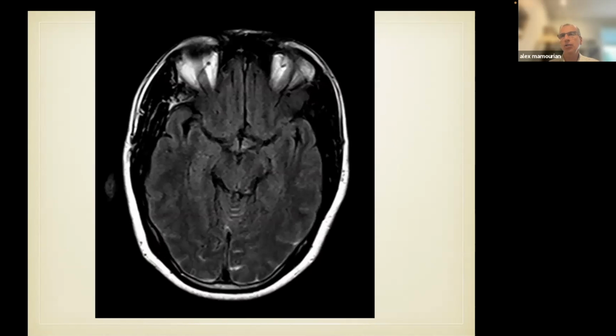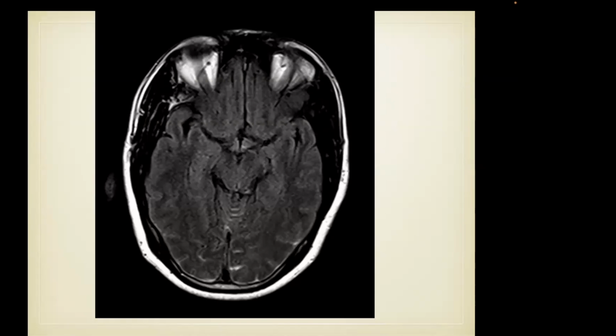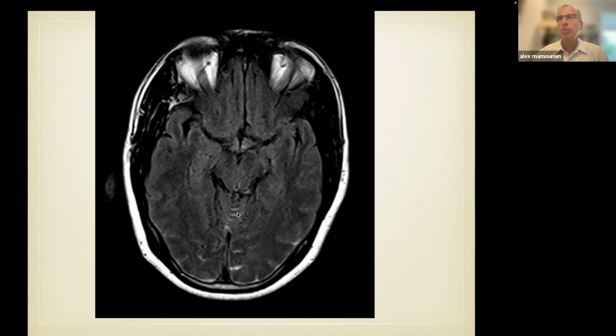just as I tried to say, if you see an abnormality on the diffusion scan, not all abnormalities on diffusion are infarcts, and not all abnormalities on FLAIR are subarachnoid blood. You can see the same pattern in patients with carcinomatous meningitis, and in people with meningitis. So all you can say is that there is an abnormality of the subarachnoid space. And if you're not sure, then those cases should go to spinal tap. And I'm going to show you some other pitfalls on FLAIR imaging.